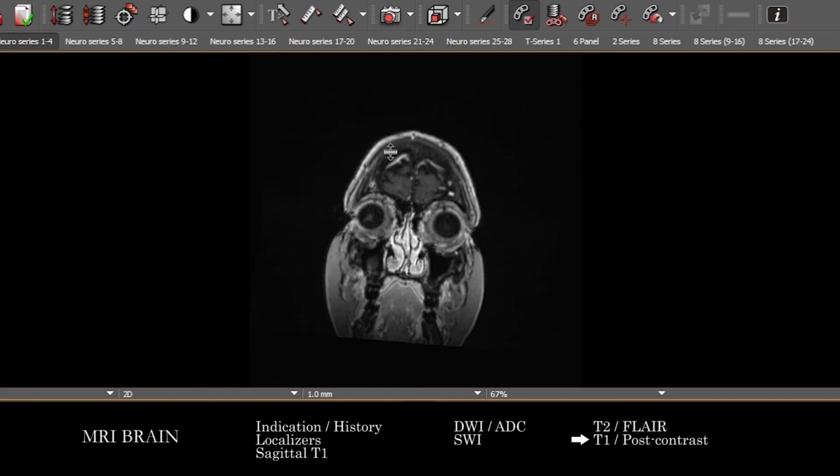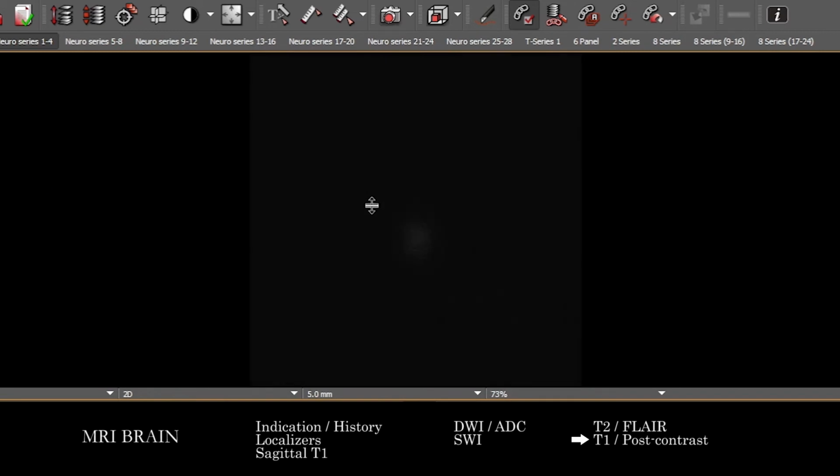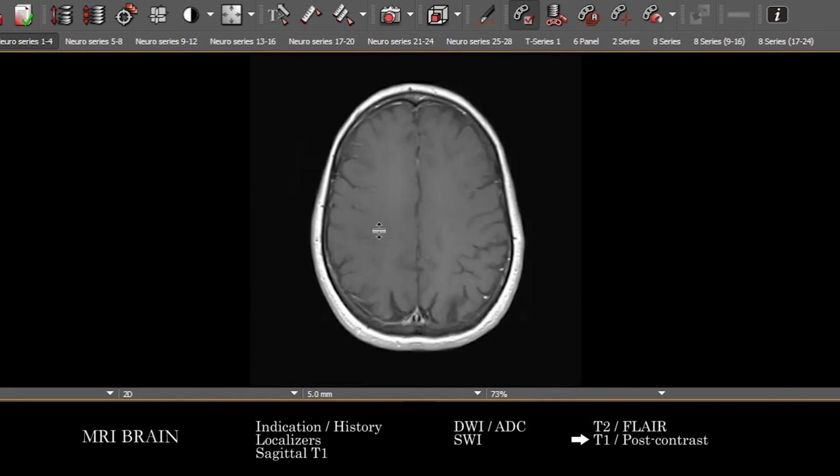I'm going to go through quickly, but you're going to use that as another look as needed to troubleshoot any abnormal findings or difficult areas of anatomy.